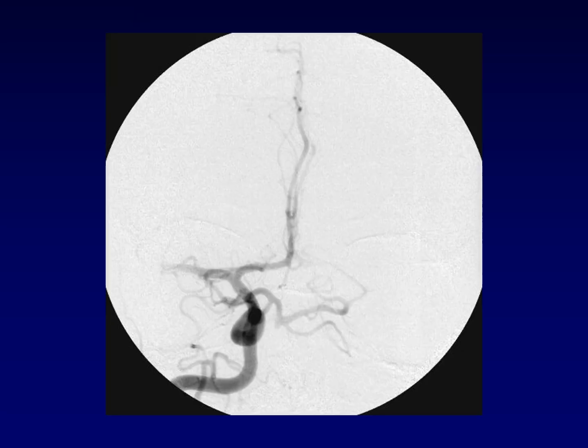How does this happen? This happens because a clot occludes the middle cerebral artery. Here's an angiogram from that same patient. You can see the inflow from the internal carotid artery. We know that this confusing thing is just the carotid siphon, no big deal. We come up on this frontal image to the carotid bifurcation, and the anterior cerebral artery is flowing beautifully. In fact, you can even see the anterior communicating artery, allowing some contrast to flow into both of the anterior cerebral arteries.